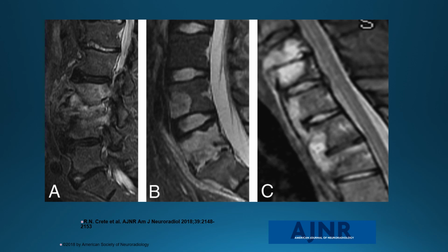Patient B has areas of vertebral involvement here. At L5S1, the disc is involved, but the vertebral involvement has a very sharp margin, unlike the vertebral involvement with a pyogenic discitis, which tends to have an indistinct margin with a normal marrow. And the third patient, you see very nice spread along the anterolongitudinal ligament. So you have this spread of infection underneath the anterolongitudinal ligament, very typical for mycobacterial infection. But this was a coccidioidomycosis. So this can look either like pyogenic or like mycobacterial, or some combination of the two.